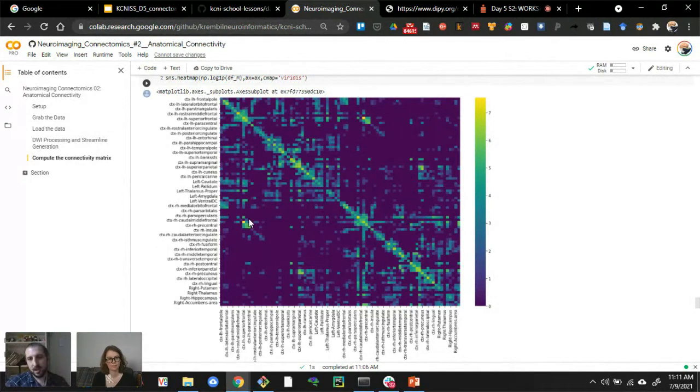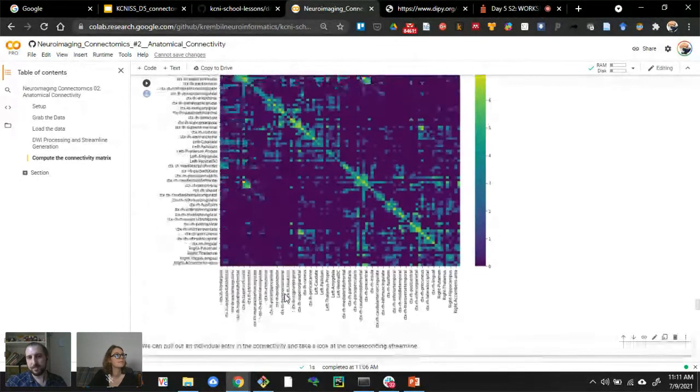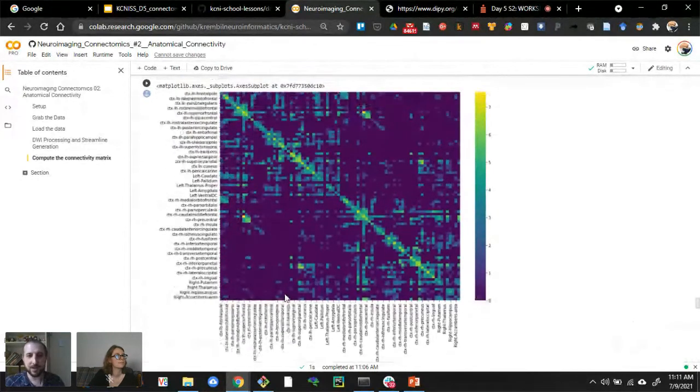This actually gives you the connections between hemispheric homologs, because it's one region in the left to the same region in the right. So you often get what we call a secondary diagonal in the off-diagonal, hemispheric blocks. We'll come back to these matrices a few times.